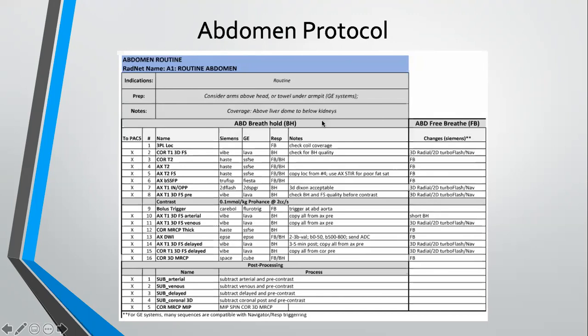This is kind of the routine. If the patient is under sedation and they obviously can't hold their breath, they're unconscious, this is what you would choose right here. So let's not really focus on this. Let's focus on what you normally see every day in clinic, and it's going to be these breath holds. And when it says breath hold, some of them are breath hold, but some of them are free breathing.